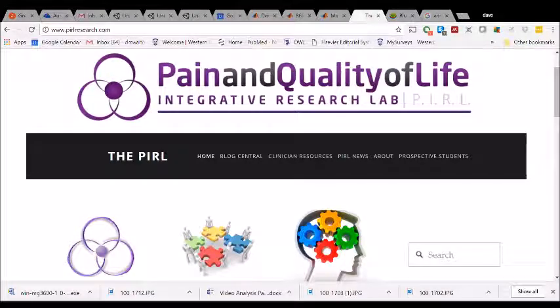Hi everyone, and welcome to this short explainer video on how to use the Pressure Pain Detection Threshold app available through the Pain and Quality of Life Integrative Research Labs website, which I've got here on the screen. You can see the URL is Pearl Research, that's Pearl with an I.com.